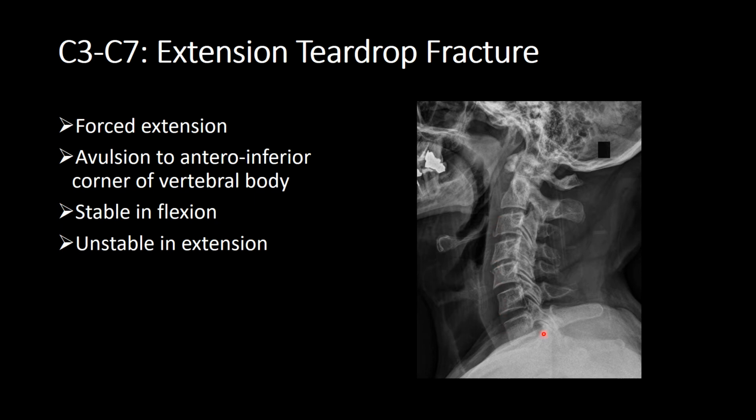So we'll go up our posterior vertebral body line. That's normal. Let's look at our spinolaminar line. Normal. There's an apparent widening of the interspinous space posteriorly, but that's just normal. That's just the large spinous process of C7, the vertebra prominens, and T1. So we look at the other interspinous distances. These are normal, so the interspinous distance is fine. So our alignment of the anterior, posterior and the spinolaminar line is all normal.